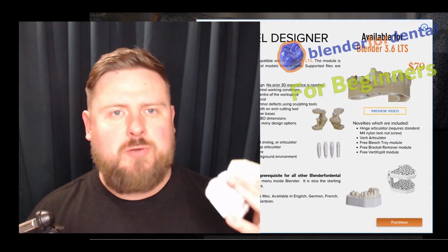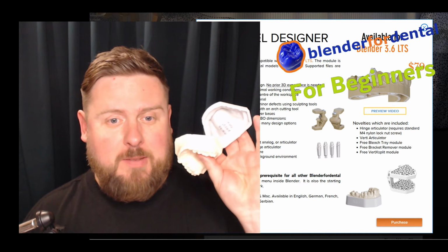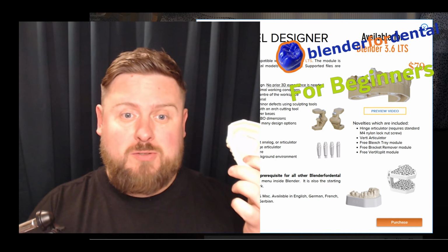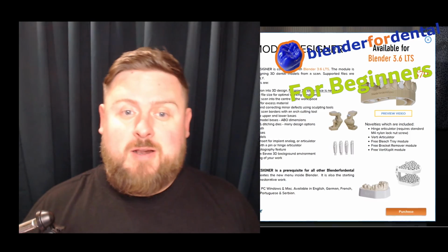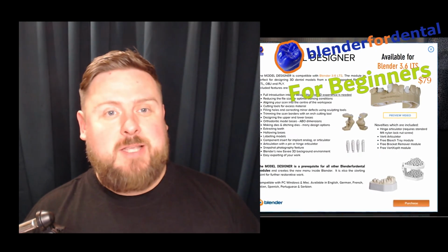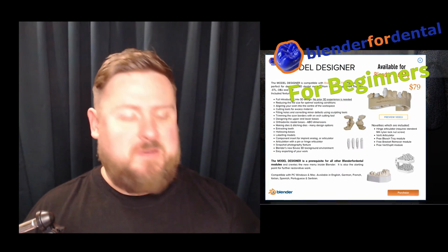Hi, did you ever search for where to make the 3D models so you could print them? Because when you get the scan files, you don't have the models, you just have the surface. Well, there are a few options. Some very popular options cost like 5 or 10,000. And if you get free software, it's very basic.